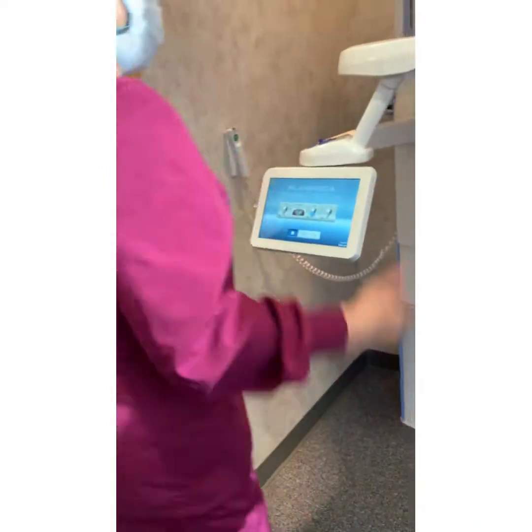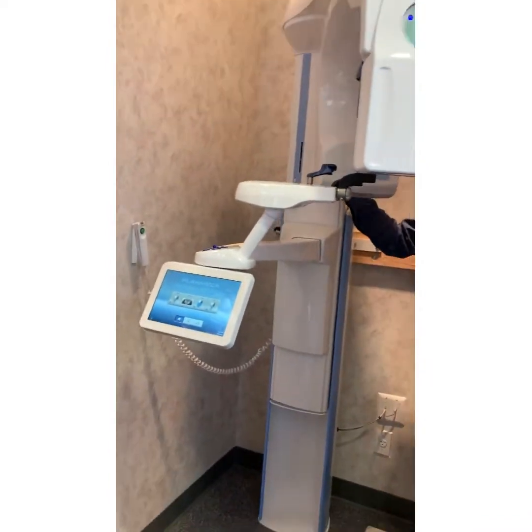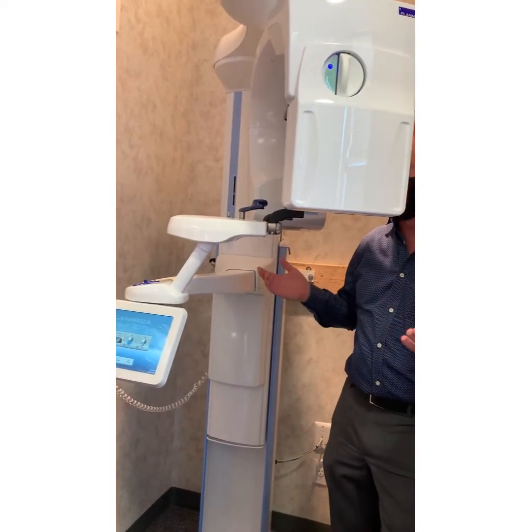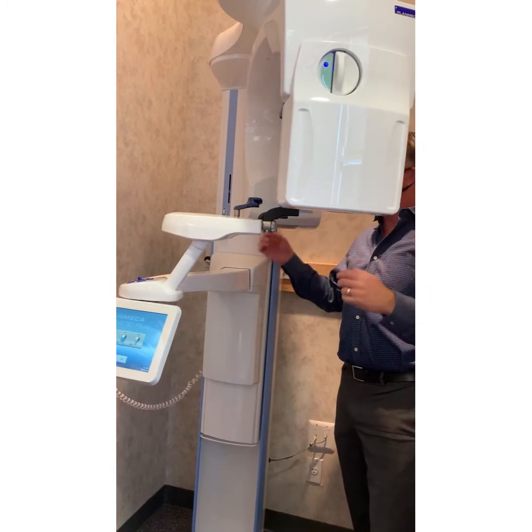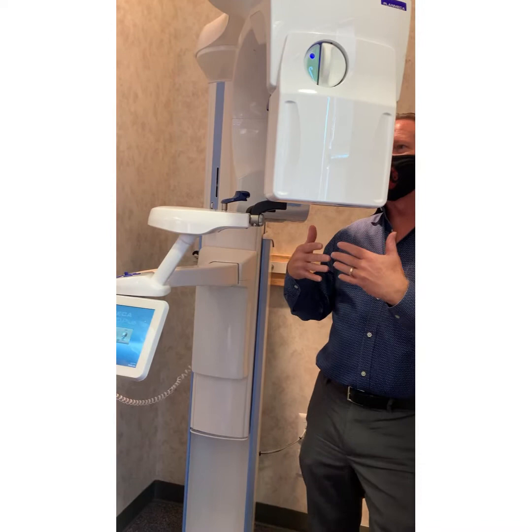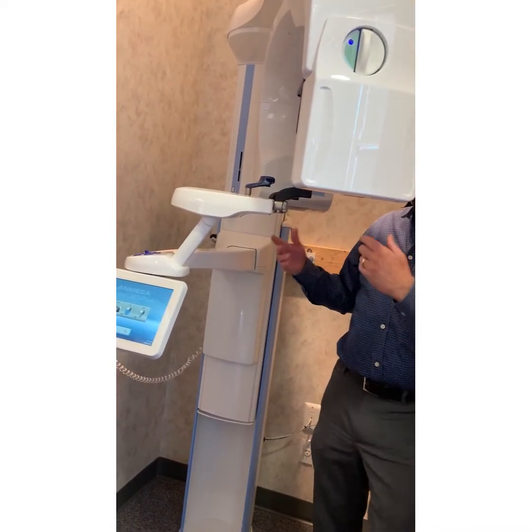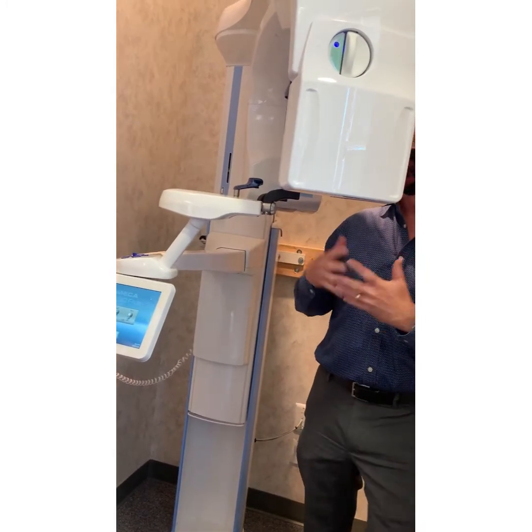It's green. And what I recommend, and every IT guy has a different idea about this, is that there's a computer in there, and this is a computer. When you guys leave at night, apparently the computers talk to each other. I don't know what they're saying. Are you awake? I'm awake. They're pinging each other. If you leave this on all the time, it has an opportunity to ping the computer, and the registries can somewhat come unaligned and cause little glitches during your day. If you turn it off at night and on in the morning, it allows the registries to realign, so you have less chance of an IT glitch.